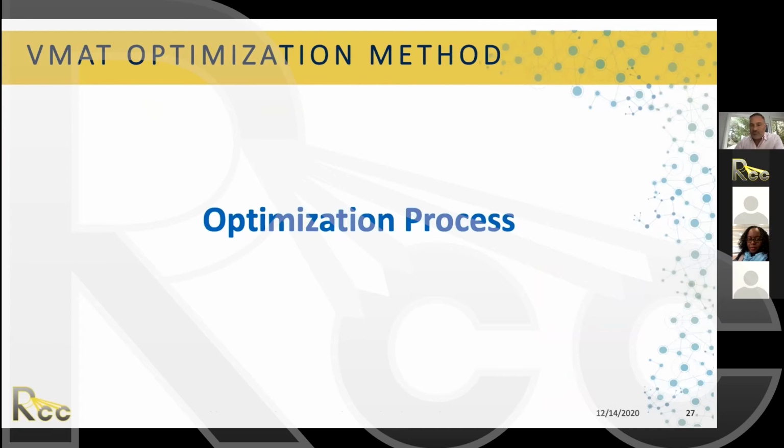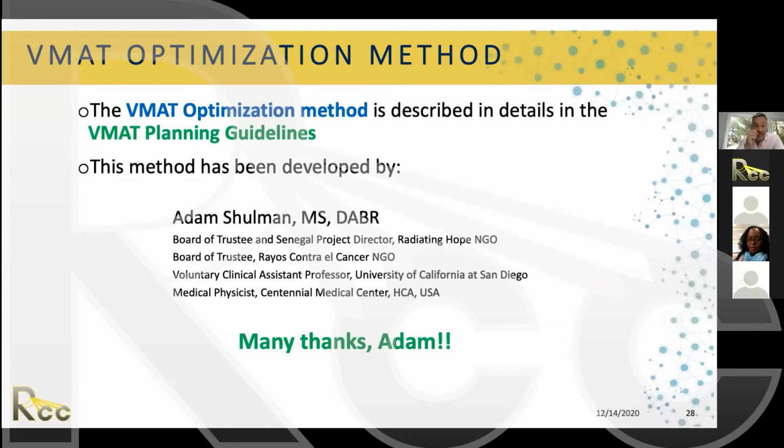Any other questions? All right, so let's move to the optimization process, because this is the main part. Again, this is very well described in the VMAT planning guidelines that we sent you from the last talk. This method was developed by Adam Shulman, just to make planning consistent.